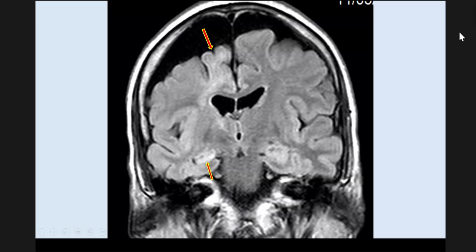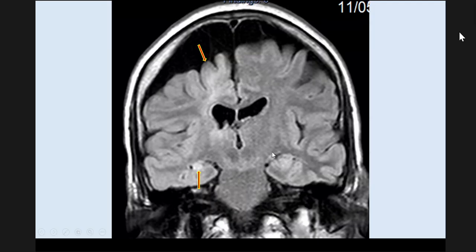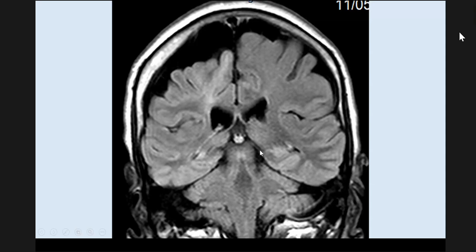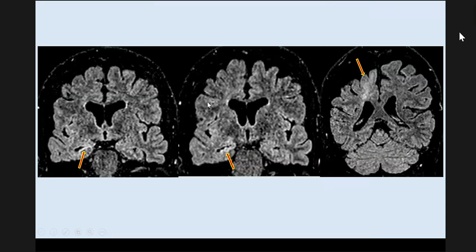And in addition, you have got changes in the right hippocampus. The right hippocampus looks brighter, and it's also smaller compared to the left. I can see the posterior body and tail of the hippocampus. The posterior body of the hippocampus is smaller than the left. And again, similar appearances on this particular image. And you can see the gliosis in the right cerebral hemisphere.